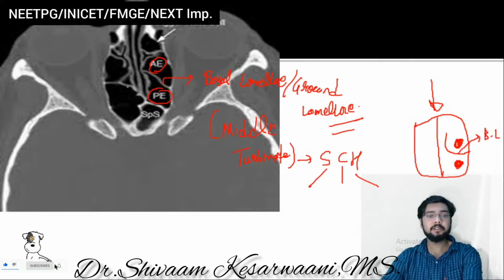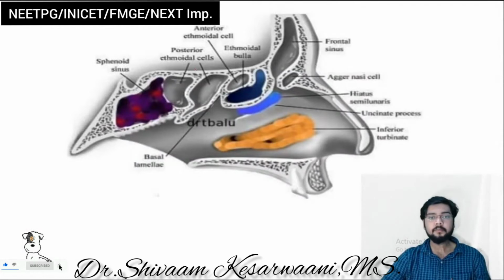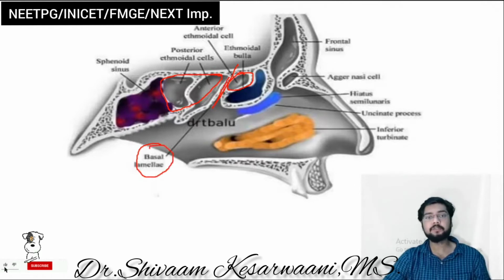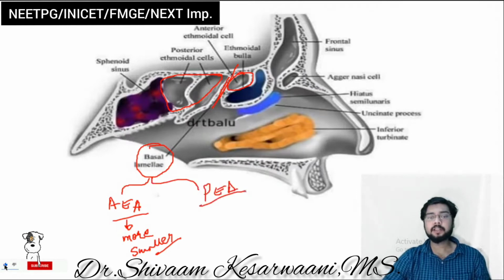If you see more here, in front of this is anterior, behind this is posterior. Again, in this sagittal cut, this is your anterior ethmoidal cell, these are your posterior ethmoidal cells, and the middle is your basal lamella. So basal lamella is separating the anterior from the posterior. One more thing you can remember: anterior ethmoidal air cells are more in number and smaller in size, while posterior ethmoidal air cells are less in number and bigger in size.